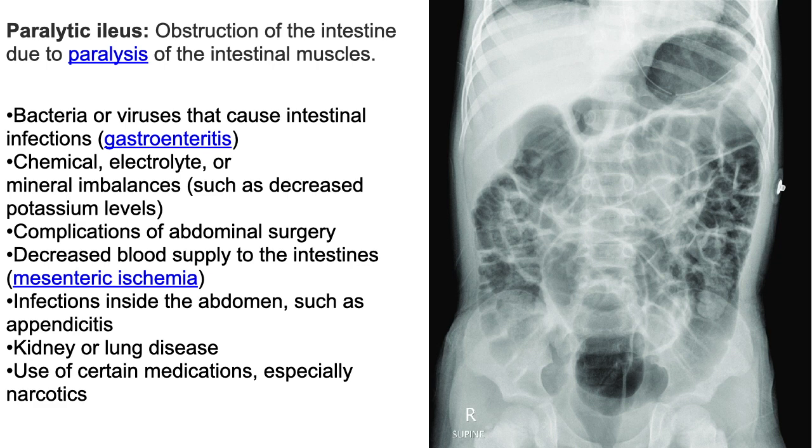This is very important because small babies or children sometimes are distended. But they are distended not because they have any obstruction per se; this is essentially secondary to a pneumonia or kidney infection, pneumonia or kidney infection and nephritis.